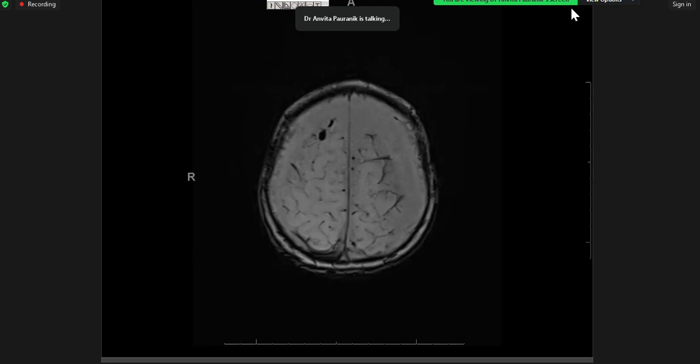The other take homes, again, I will emphasize: do not use the words clinical correlation. Do not call sinusitis and mastoiditis based on CT alone unless you see adjacent complications like abscesses or venous sinus thrombosis, because fluid in the mastoid and paranasal sinuses is extremely common. Try to make your own checklist.